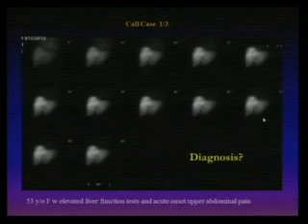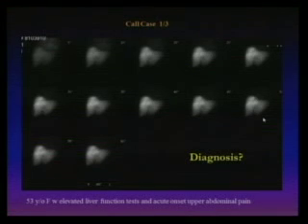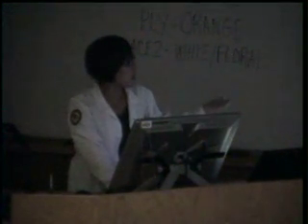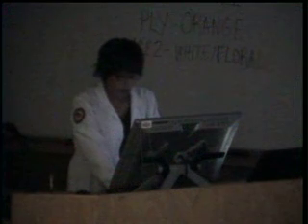Where? In the CBD or somewhere? Well, actually not even in the CBD, because that I would think would fill up the gallbladder. So I'm thinking probably higher than the CBD, in the hepatic duct. Probably in the CBD, because your pressure is very high, the tracer cannot be excreted at all. Even the gallbladder will not fill because you did not even see the intrahepatic duct. It would be the same pattern of cystic obstruction as well, right?